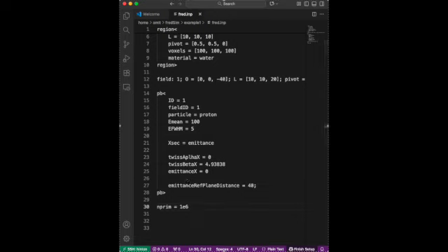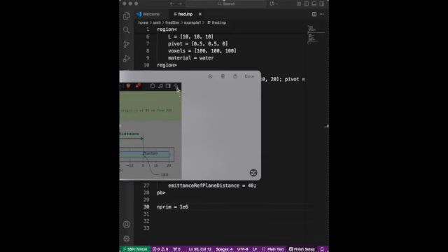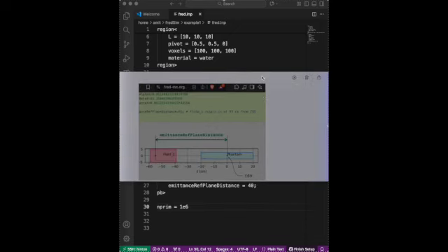I promised you to show the plane. It is the distance between the phantom isocenter and the point exactly from where the beam comes out.